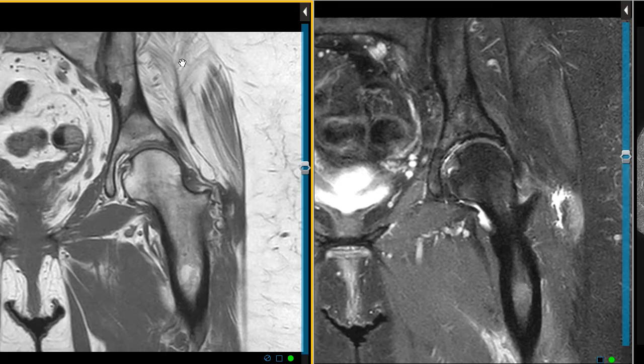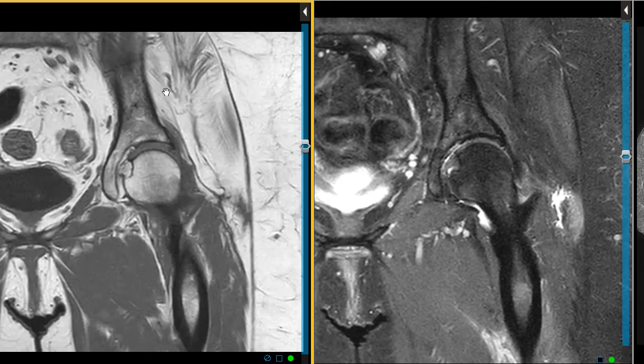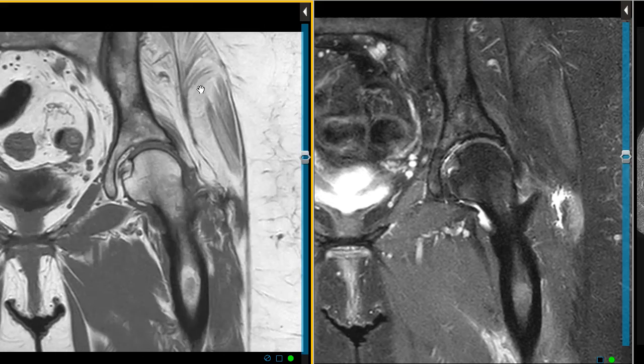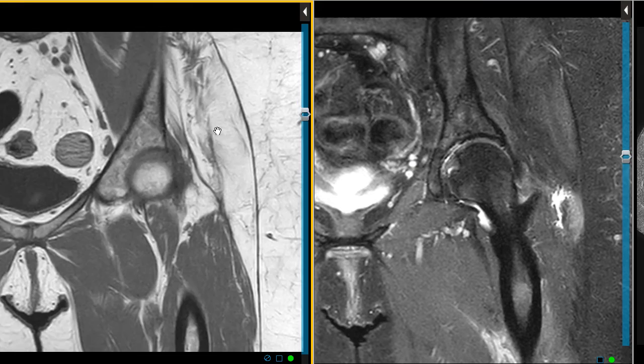Now there's something wrong with her muscles here. So the muscles down here are dark. Up here they're white. So this is fat completely filling these muscle groups here. There's the deep one here, the gluteus minimus muscle. And then over the top of that, we have the gluteus medius muscle. So gluteus medius and gluteus minimus, more deep. They blend together. It's hard to tell them apart. But there's a deep one and superficial gluteus minimus and medius.